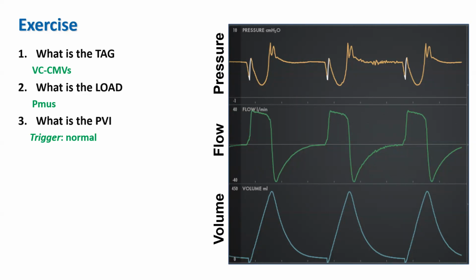So what about the trigger? Well, that seems fairly normal. It happens pretty quickly. This is a pressure trigger, as you can see. Inspiration, again, severe work shifting. Pressure is dropping way down, severely distorted.